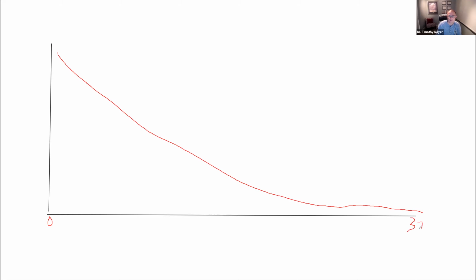We know that this slope from the theta to the low beta should be 2.5 to 1. So if this was at 2.5 right here, the height at the halfway point of the thetas, then I know that the halfway point of the 16 to 20 hertz would be at 1. That would be the perfect pitch.